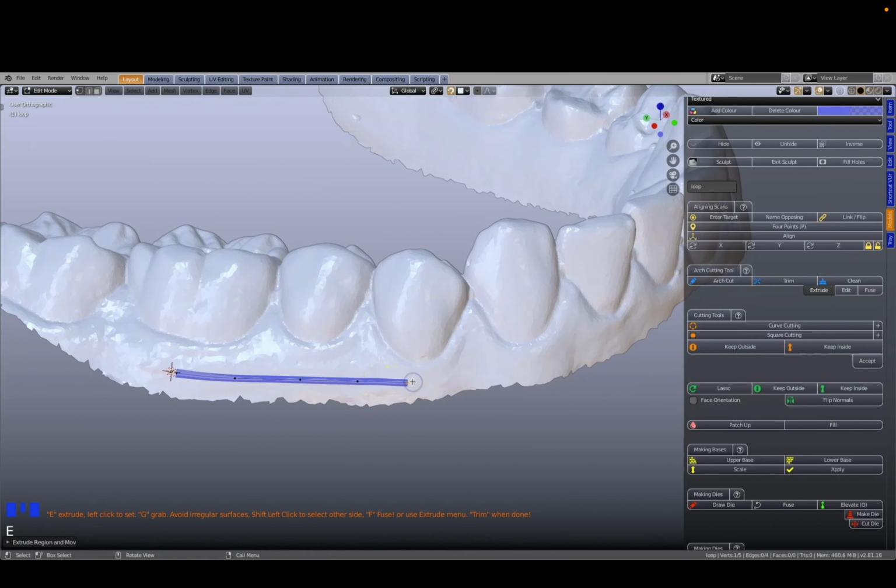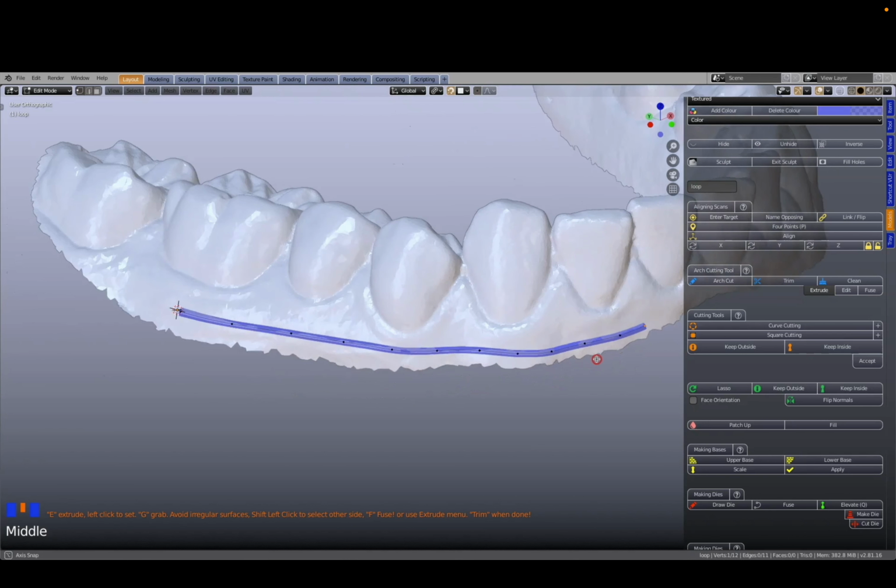For those of you who would like to streamline the outlining process, navigate back to the menu and press on the Extrude tab. This will allow you to automatically set down the line by only using the left click on the mouse. Go back to the model, and this time, only left click to set down the line. This new feature will now give you two different ways to handle this procedure. We will fast forward this section.